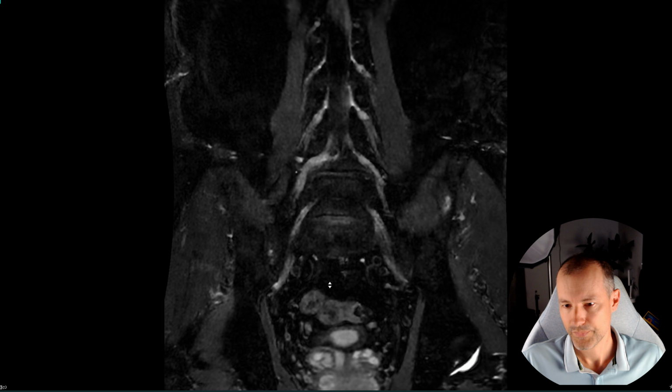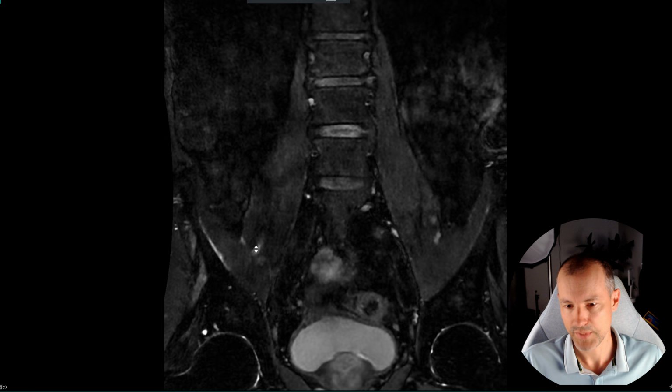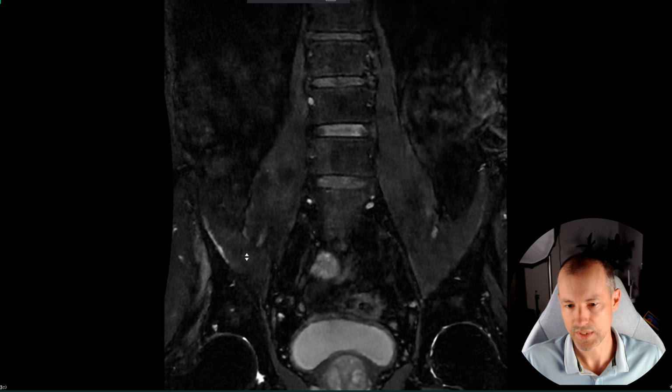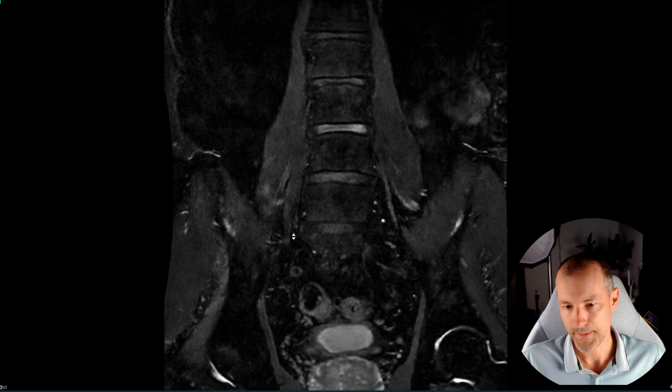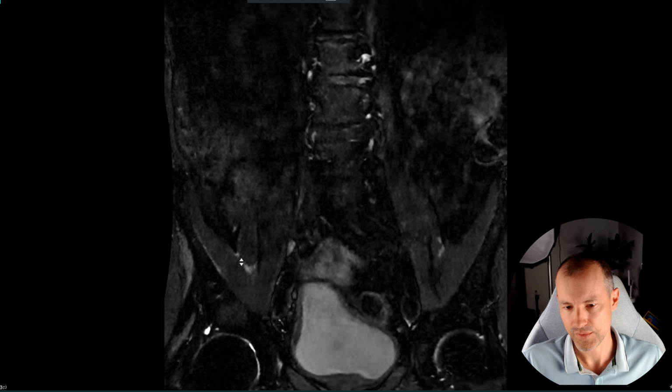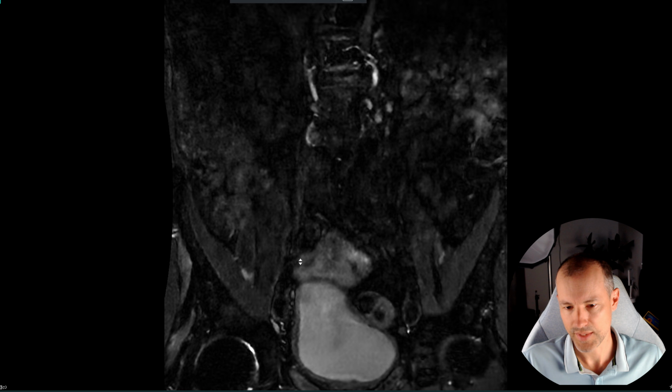And yeah, so I think this was a highly interesting case. Anatomic variation, femoral nerve splitting here with an accessory slip. I don't know, potentially disruption of one of these fibers. Maybe I should add this in my report actually, because it looks like it's ending blindly.